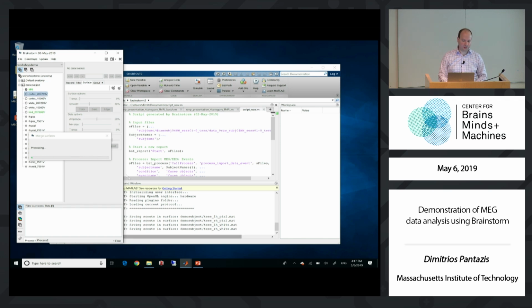You can see how we also have the very large surfaces with 267,000 vertices, but also the downsampled surfaces here, which will be used for analysis. And again, this will be way faster in the desktop computer rather than this laptop here.